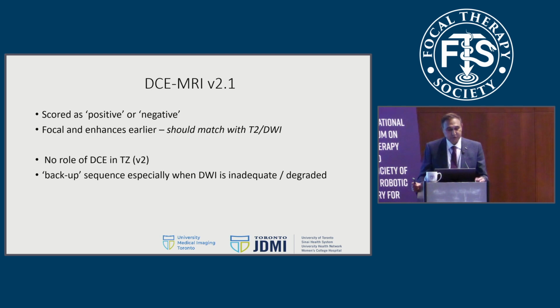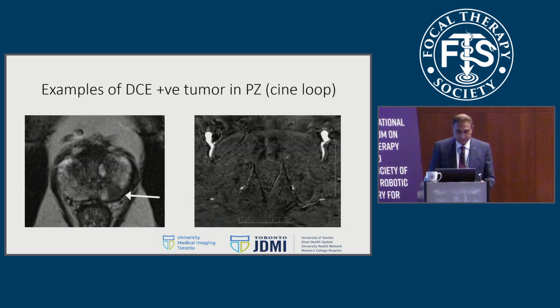And a positive score is when you see a focal area of enhancement, it should be enhancing earlier than the rest of the gland. And it should match to an abnormality seen on the other sequences. DCE does not have a role in the transition zone, and that's because many benign nodules may enhance early as well, so it's really got no role there in PI-RADS scoring. And it is also a backup sequence, especially when diffusion-weighted imaging may be inadequate or may be degraded.